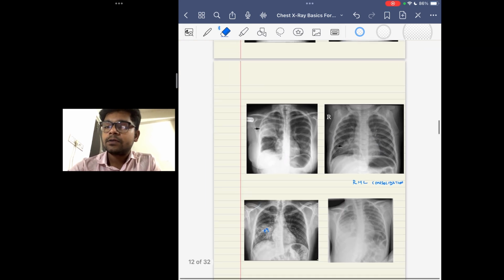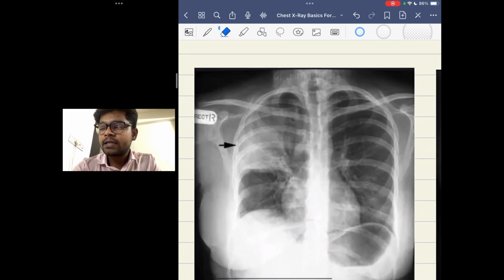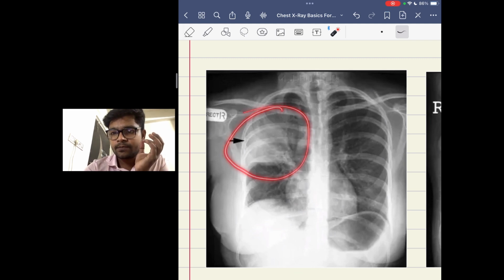So, right. Can we see these X-rays, and now we are in a better position to appreciate the consolidation. You see that this is a PA view, definitely this is a PA view, and the angles are clear, fine. The trachea is deviated somewhat to the right, but probably of some rotation component. But notice this pathology here.